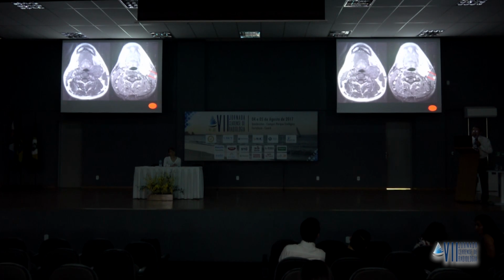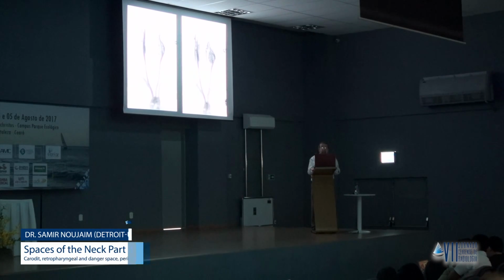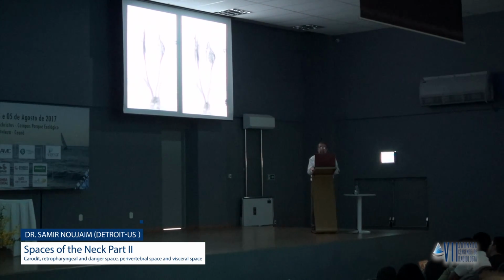I can see here some signal voids on the post-contrast. Here the salt is the tissue that's enhancing, and the pepper are the dark vessels. These lesions are very hyperintense. And when you do angiogram or MRA or CTA, you're going to see a very intensely enhancing lesion at the level of the carotid artery bifurcation, with the characteristics of very intense flow, and early draining veins are not uncommon as part of that vascular change.